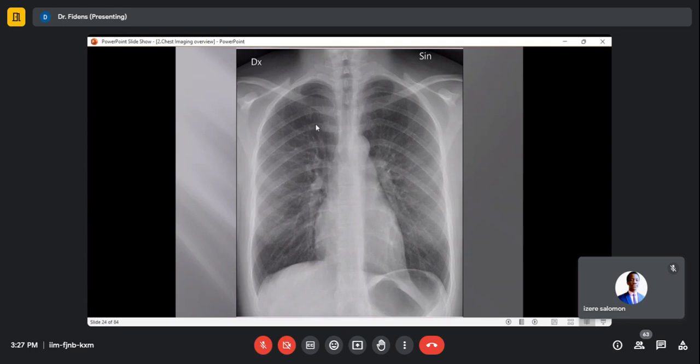Even if that is not what you had looked at, still the posterior ribs are not 7, they are more than 7. So the anterior ribs: this is the first one here, anteriorly. Second, third, fourth, fifth, sixth, and seventh. The seventh is not counted because it does not close this mid-clavicular line above the diaphragm. Very clear.